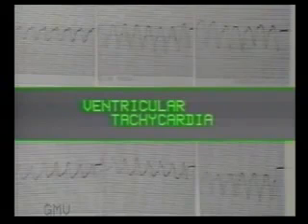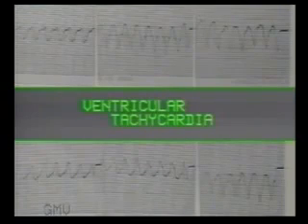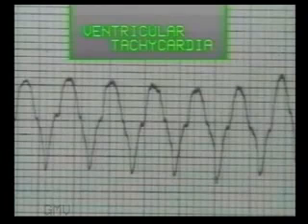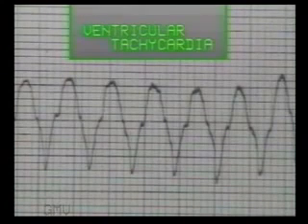If the QRS complexes are wide with inverted T waves, then it is a ventricular tachycardia. Observe this strip carefully. The wide and bizarre QRS patterns suggest a ventricular tachycardia. The rate, like paroxysmal supraventricular tachycardia, varies from 160 to 220 per minute. However, when this picture is seen, we must also rule out a supraventricular tachycardia with aberrant ventricular conduction of bundle branch block type.